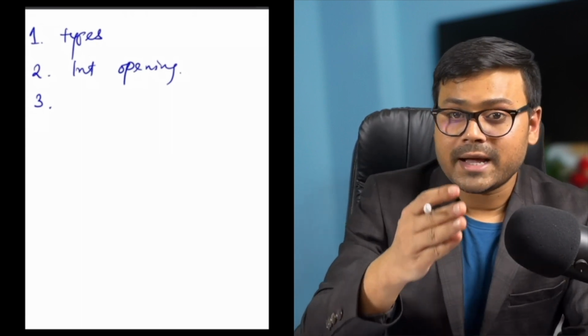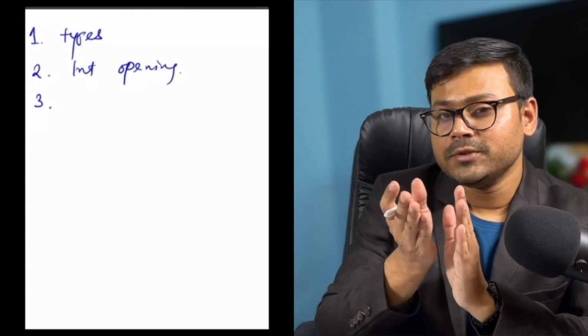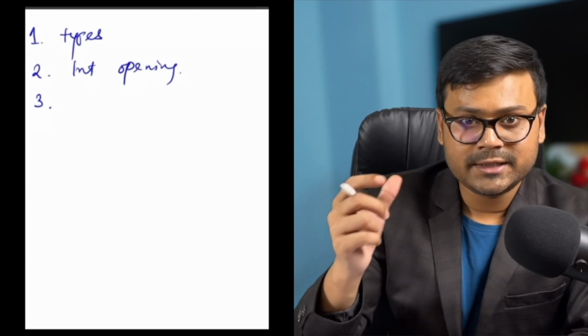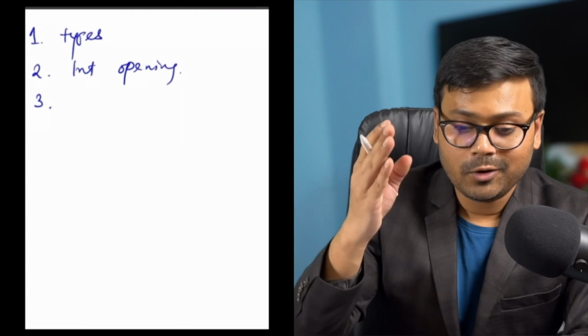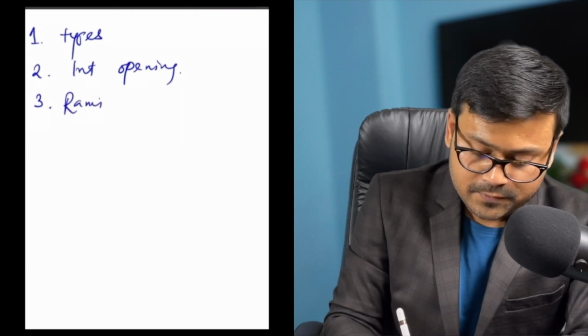Ramification means a branching tract. You are seeing the main tract, and on the opposite side there is a branching tract. You should mention that a branching tract is present and mention the position. And if no branching tract is present, you should mention in your report that no ramification or branching tract is present. So, ramification.